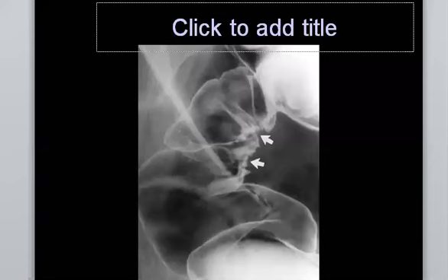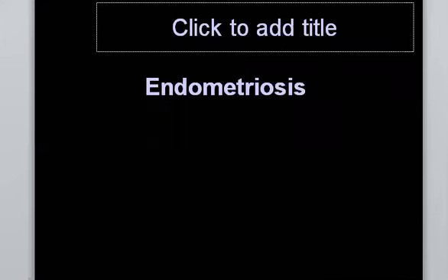Yes. So in this one, what we call it, endometriosis. Why endometriosis? One of the good differentials, as we mentioned, that makes an extrinsic effect in the barium. So when you find this appearance, you should put in your differential something which is endometriosis.